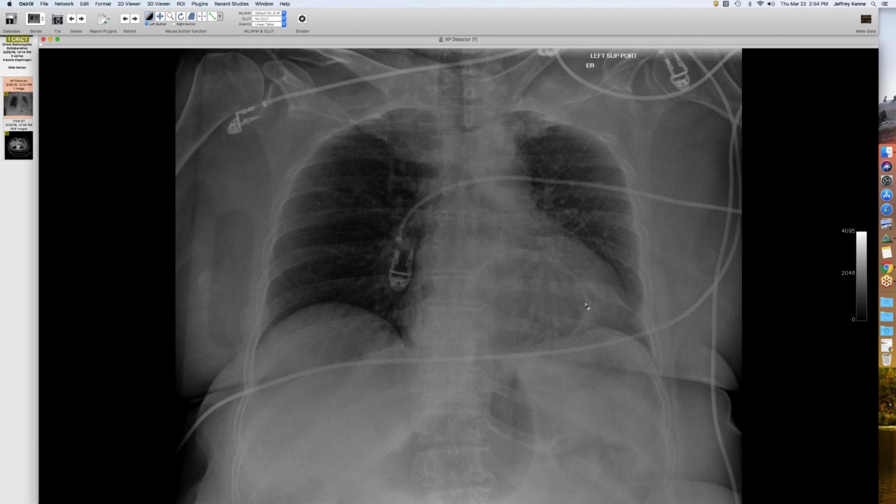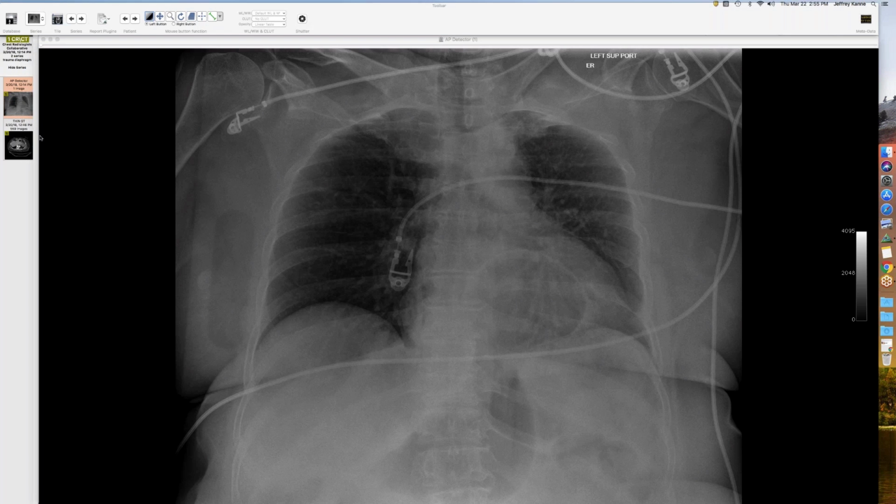And you can see what appears to be a gastric fundus up in the chest, and you can still see the lower lobe vessels behind it and still make out the heart. So one would probably argue, based on the frontal projection, this is an anterior location. So it could be a congenital hernia, Morgagni hernia, or something like that. But in the setting of trauma, of course, you can't make that assumption, especially if you don't have old imaging.